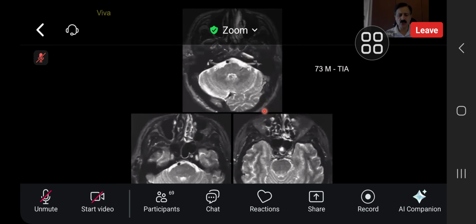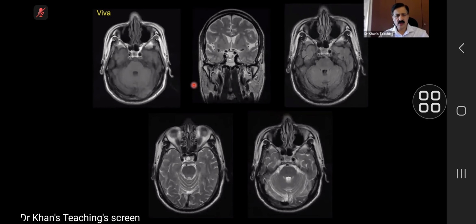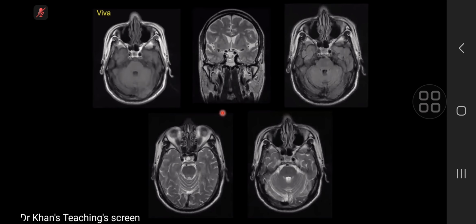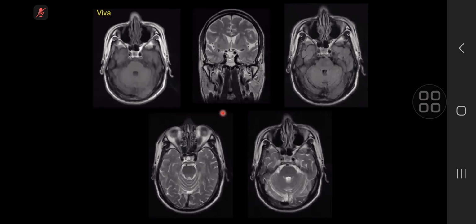Means complete thrombosis of the left ICA. Well done. Yes, please. Okay, so I'm presented with axial and coronal slices, the majority on T2. Just look at the cavernous portion of the ICA. There's crescentic hyperdensity in the right ICA, worried about dissection or thrombus.